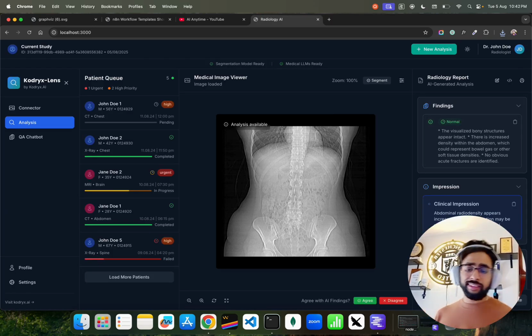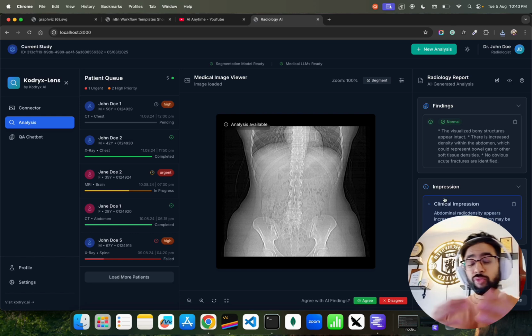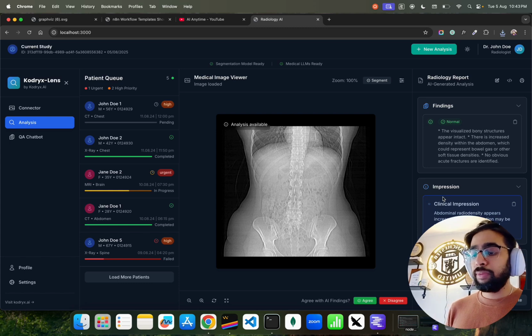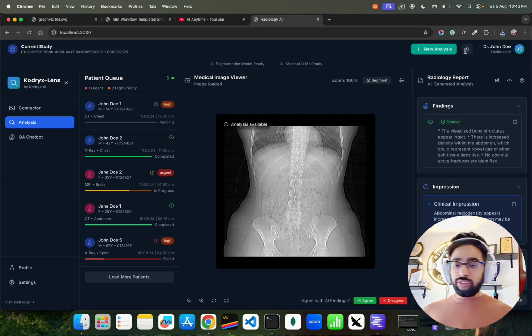The EHR connection is still not there in this interface. The scope is beyond this tool. That requires further integrations with EHRs or EMRs. They would have their API endpoints. We have to interact with those API endpoints to integrate these kinds of interfaces. Now that's the one thing.